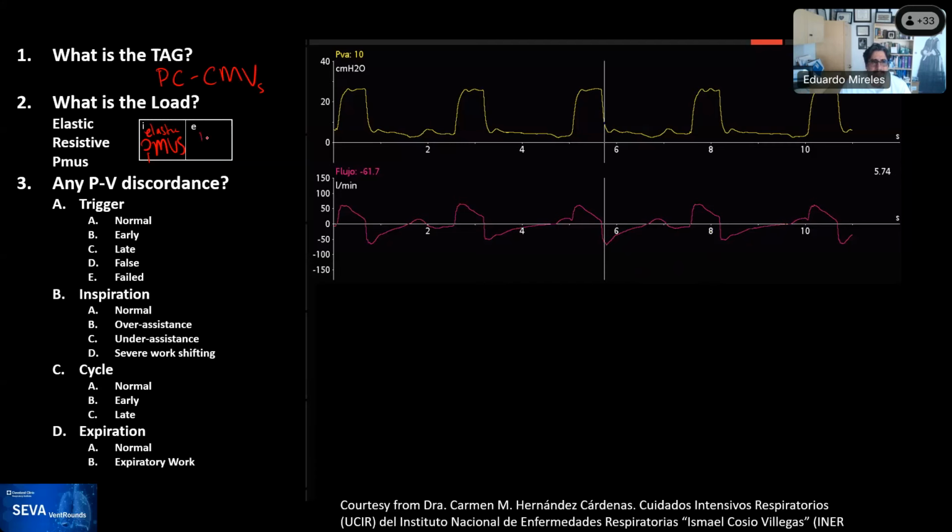So I'm gonna say that it's probably elastic, but there's a lot of noise. It's hard for me to determine it. And when I see those oscillations, you can speculate, but you cannot firmly say it. And sometimes there are other features that we can use to detect that.